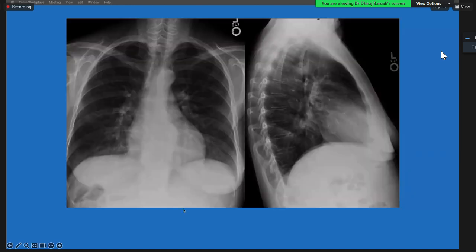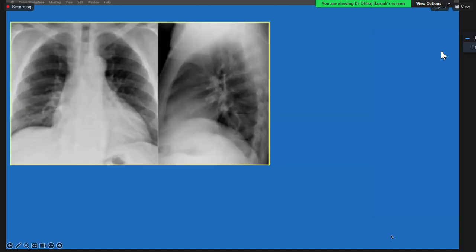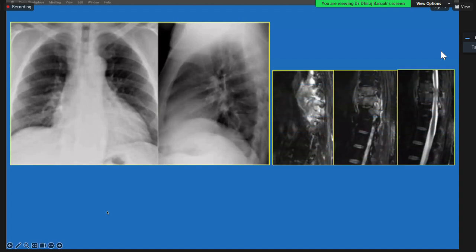And here you see an abnormality which is displacing that line, lobulated margin. You do not see much on the lateral X-ray. This is what I have noticed with this abnormality. So this is esophageal varices, which causes widening that you may not see on the lateral radiogram. Coming to this one here, pay attention and see that displaced paravertebral line out there, and this is what typically you see with spondylodiscitis and paravertebral abscess.